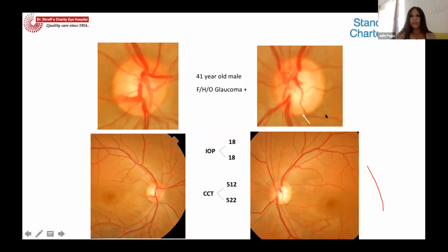And if you just look at the optic disc, the optic discs are medium in size and they were looking healthy enough. Even the cup is not very deep. But if you look beyond the optic disc in a dilated examination, then you can appreciate this RNFL defect which has started to form here. So obviously when you see a sign like this, do not take it lightly.